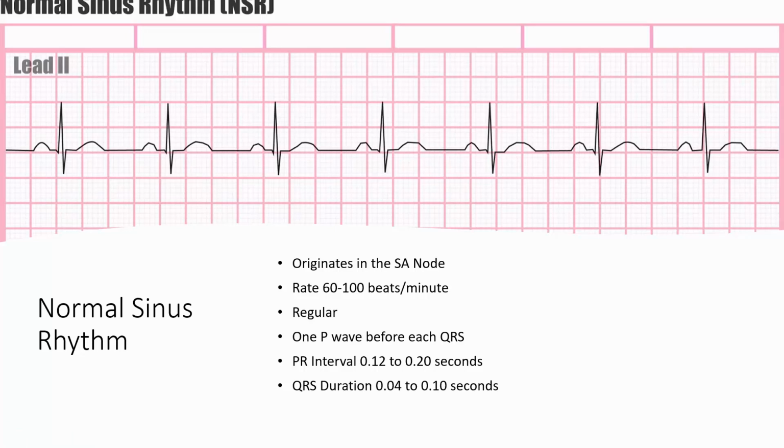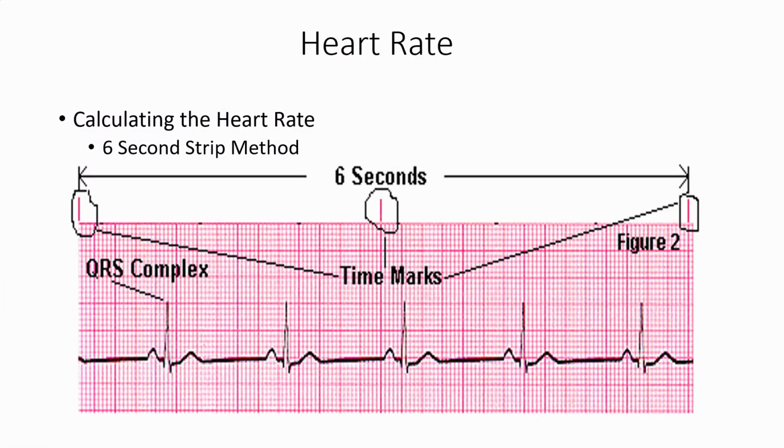Okay, so there's two great examples, and guys, now you know how to look at your rates. So that's one thing I want you to take some time and practice learning your rates. It's the first step in the 5-step method. Okay. So before we move on, I like to talk about some of the other steps.